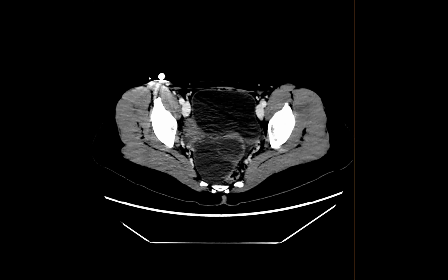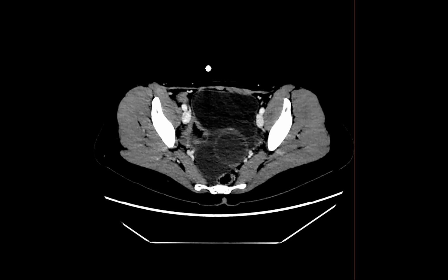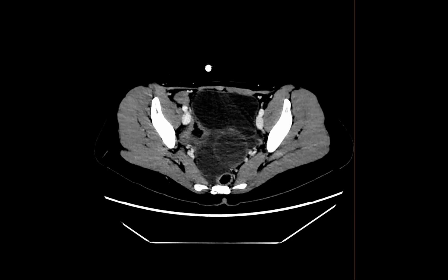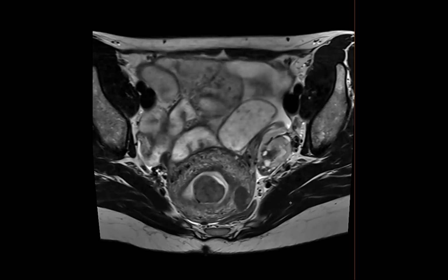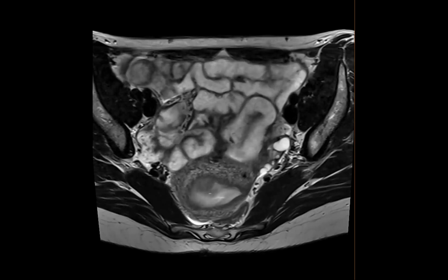So I think maybe, I don't know if one caused the other. Maybe the cyst was there, and then it was a lead point that led to the torsion, which then became hemorrhagic from venous congestion. I don't know, but all of it was new compared to a handful of months prior, when the left ovary looked pretty normal. So it made malignancy less likely given the timing.